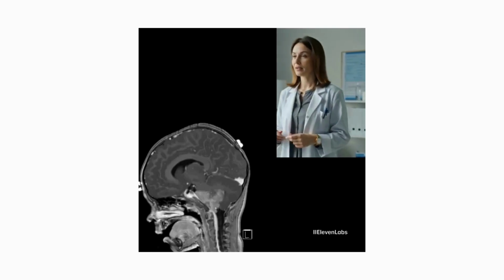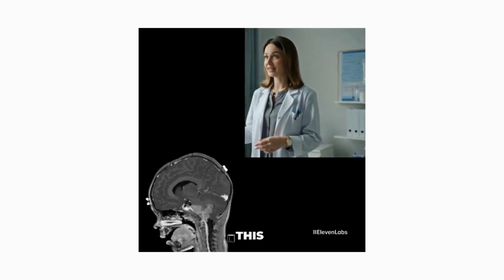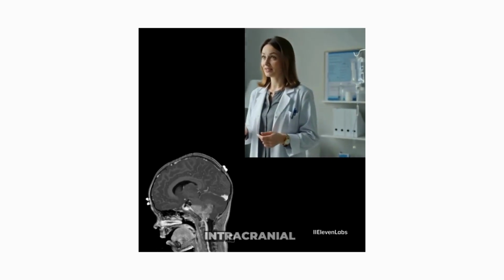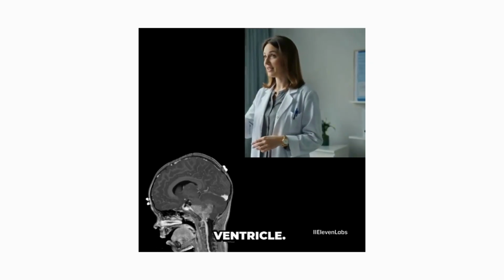Welcome back. Today, we have a diagnostic challenge that every radiology resident must master. Look at this 6-year-old child presenting with ataxia and signs of increased intracranial pressure. We see a large, heterogeneously enhancing mass centered in the 4th ventricle.